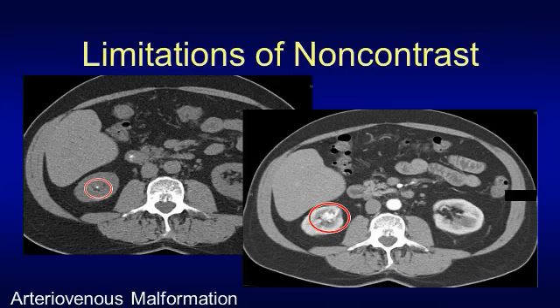You may pick up appendicitis, you may pick up some sort of enteritis or colitis on the scan, even without IV and oral contrast, but if there's a possibility of other pathology, particularly appendicitis or any kind of vascular abnormality, you really should be giving IV contrast and in some cases oral contrast. So let's go through some of the things that we miss on the non-contrast study just within the kidney alone. Okay, here's the first case.